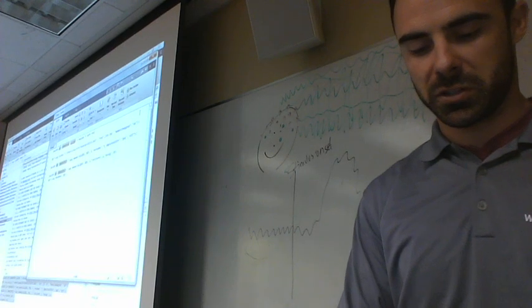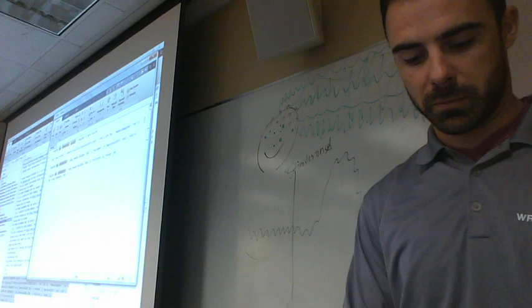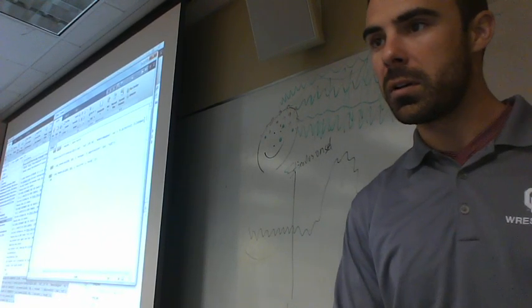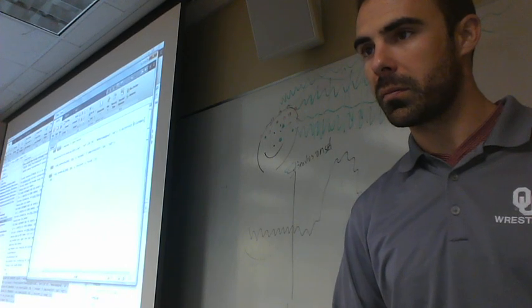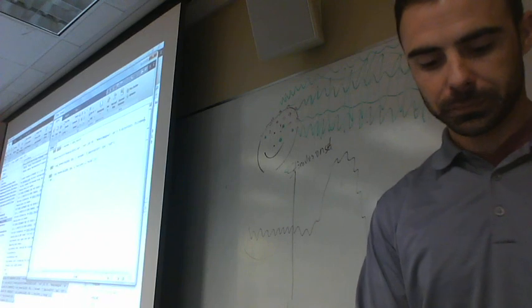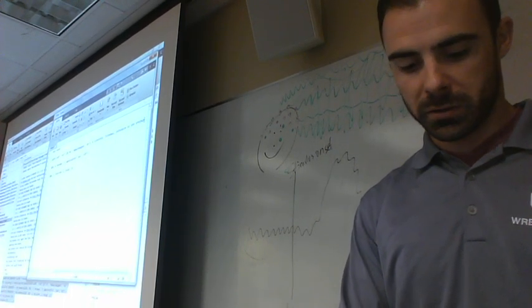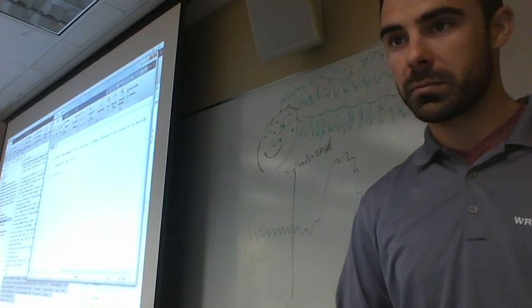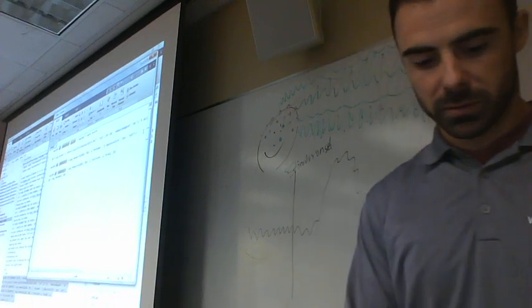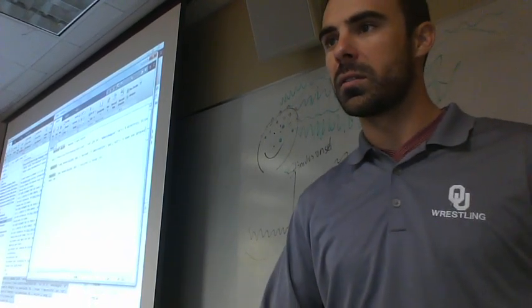Open EEGLAB. Over here, I'll say directory, file name. So this is everything I just kind of told you, right? Reference to the average of the mastoids. Okay, and then name new data set.